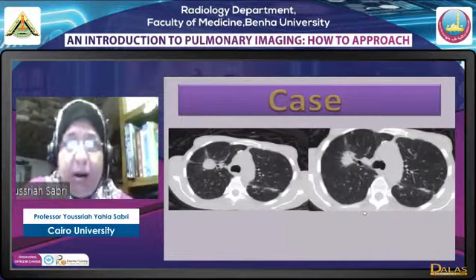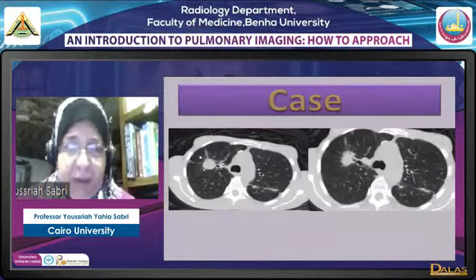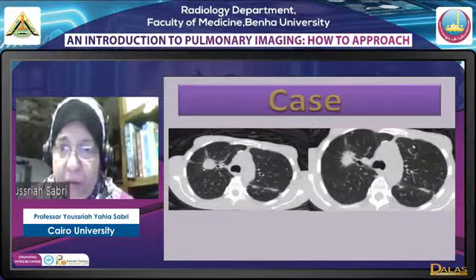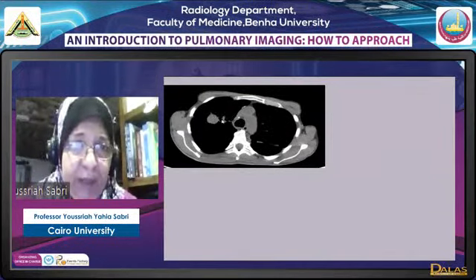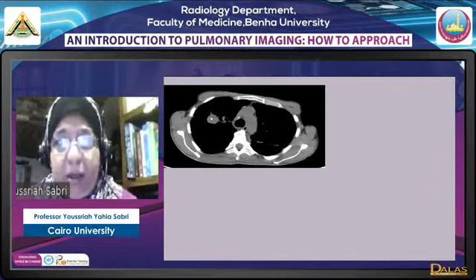This patient had a scar in the right upper lobe, okay, with decreased volume of the upper lobe. As you see, the fissure is shifted. This scar has a rather suspicious look. It was associated with nodules spread in both lung fields and thickening of the fissure. In the mediastinal window, it is of soft tissue density. There are also, as you can see, calcifications here. It's healed tuberculosis. The patient had a history of healed tuberculosis. Okay, but still the scar is very suspicious.